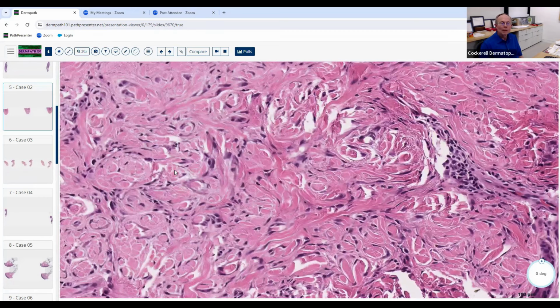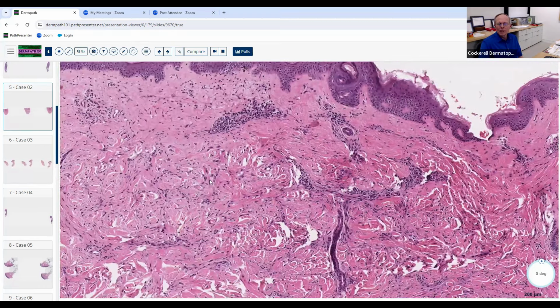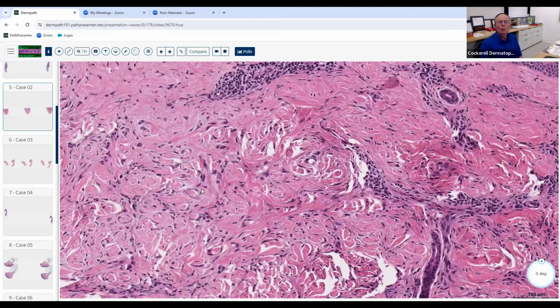Perhaps you'd also want to think about things like metastatic breast carcinoma, or a leukemia that might be spreading to the skin secondarily, or nephrogenic systemic fibrosis, which can give you a lot of fibroblasts that go diffusely between collagen bundles. And of course, usually you wouldn't see this busy dermal morphology with morphea, but in the inflammatory stage of morphea, or so-called keloidal morphea, where you can get fibroblasts plus sclerotic collagen, that can give you this pattern.